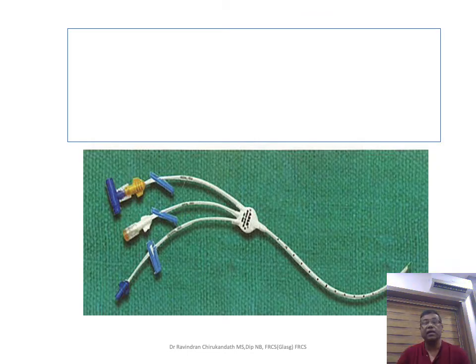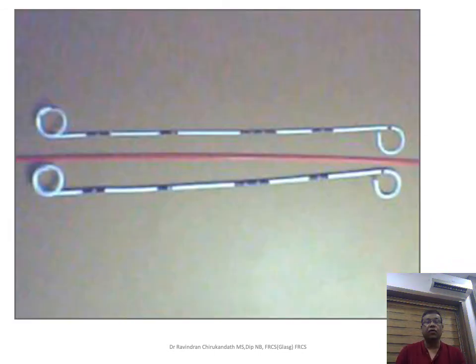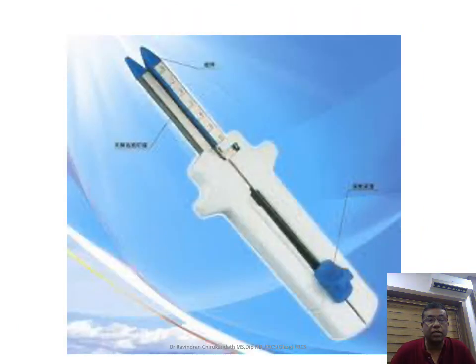This is a central venous catheter. It's a type of central venous catheter which is used for central venous pressure monitoring as well as central venous blood inflow. This is a double J stent used for ureteric surgeries. You can see there is an upper as well as a lower J, which is self-retaining, and you can take it out once the initial uses are over.